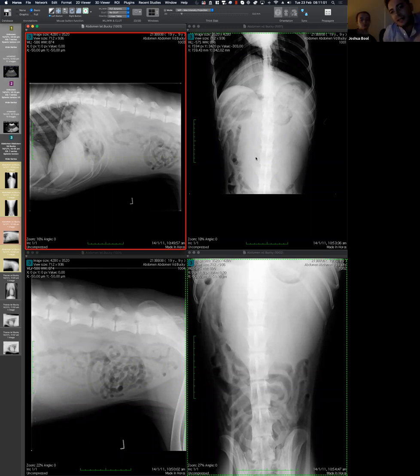On the VD as well, I think I can see in that area that we're questioning the silhouette of the left kidney, which I imagine probably provides more argument for a mass or a fluid-filled structure, with the kidney kind of sitting on it, but not within it. So perfect. I assume it's less likely to be surrounded by fluid, because we would efface the kidney.